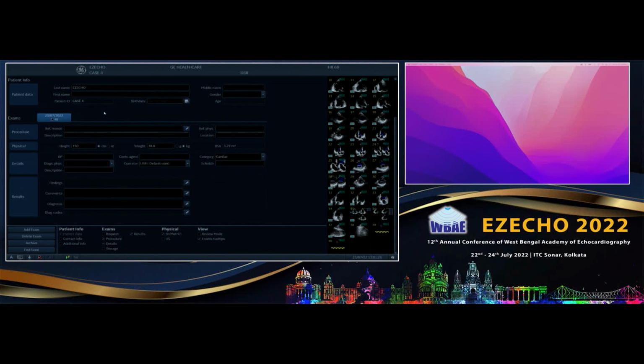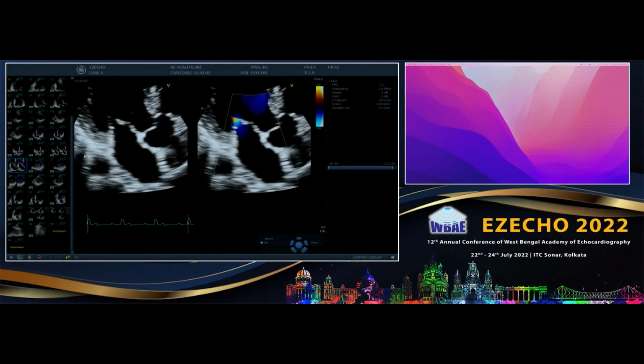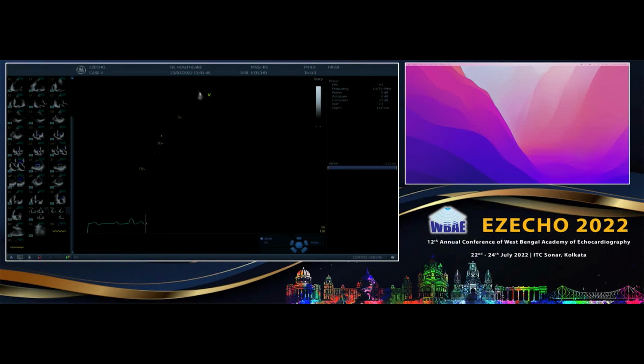But if you look at these patients with mitral annular calcification, I know that they are going to have diastolic dysfunction because they are a subgroup of patients, unless they are rheumatic. Any elderly patient getting a mitral annular calcification or structural calcification generally has multiple comorbidities, and that itself is a sign of the patient going into HFpEF. Most of them will have hypertrophy, calcification of the annulus and multiple comorbidities. So annular calcification itself tells you this patient is going in the direction of HFpEF or probably AFib also. They will have larger LAs and everything.